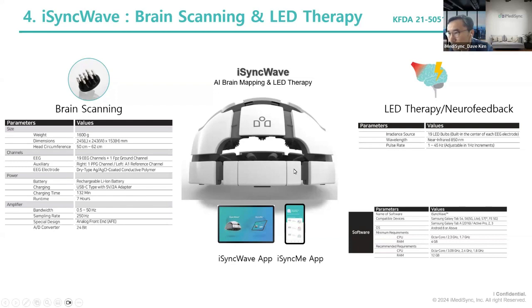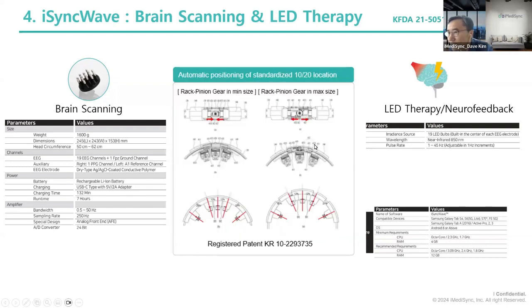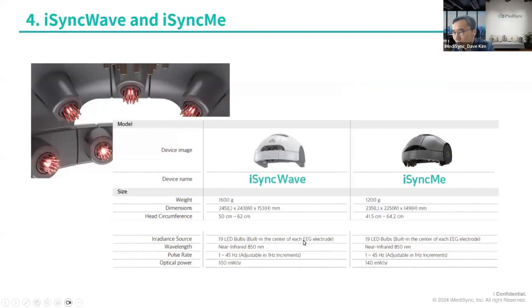I think this is another specialty of our dry EEG headset. A specific gear structure makes a proportional expansion while maintaining suitable contact pressure at each electrode position. So automatic positioning is the specialty of this device.